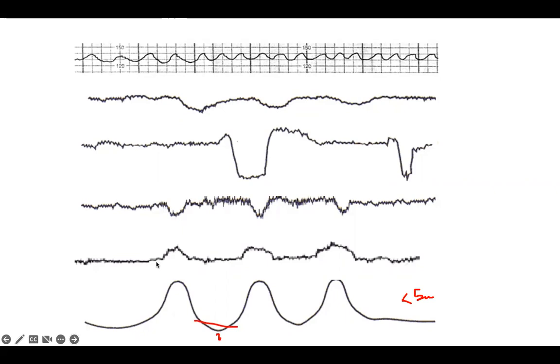Then the first one, you look, as the contraction begins, what happened to this? They begin to rise, then come down at the end of the contraction. As the contraction begins, it rises. So this is acceleration. This one, you start from here, right as the contraction begins, the baby's rate comes down. And then at the peak of the contraction, it's a mirror image of the deceleration. And this is the early deceleration.